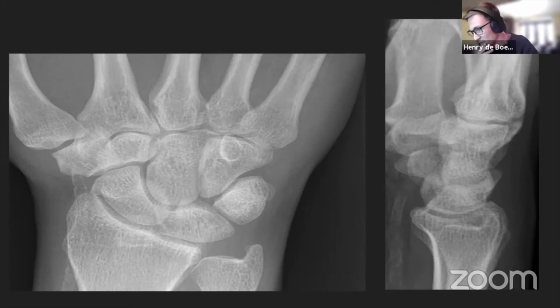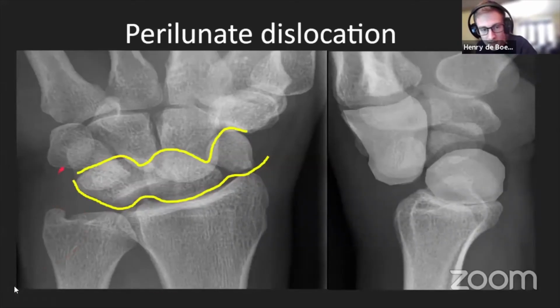Okay, so your question about the previous film was whether the gap between the ulna and the carpal bones is normal. I'm just going to quickly flash back. Yes, this is normal-ish, because we've got this triangular fibrocartilage that sits in this triangular shaped gap here. But this contour isn't normal. But this specific gap, yes, that probably is normal.